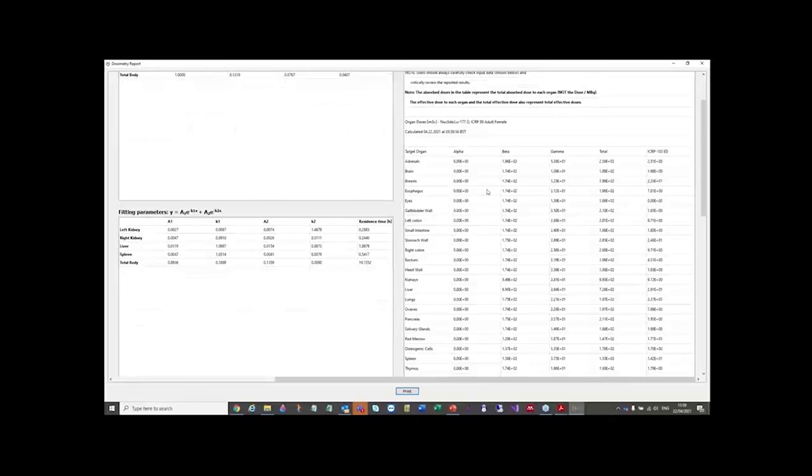So we're looking here at the full doses. You get everything, because the Olinda model works by saying if you've got some activity in one of the organs, say the liver, you get that cross dose factor to all of the others. Even if it's only very small, you still get a dose for all of the organs, but only the ones that you did draw will have the self dose factor included, which is normally much the largest contribution to the dose.